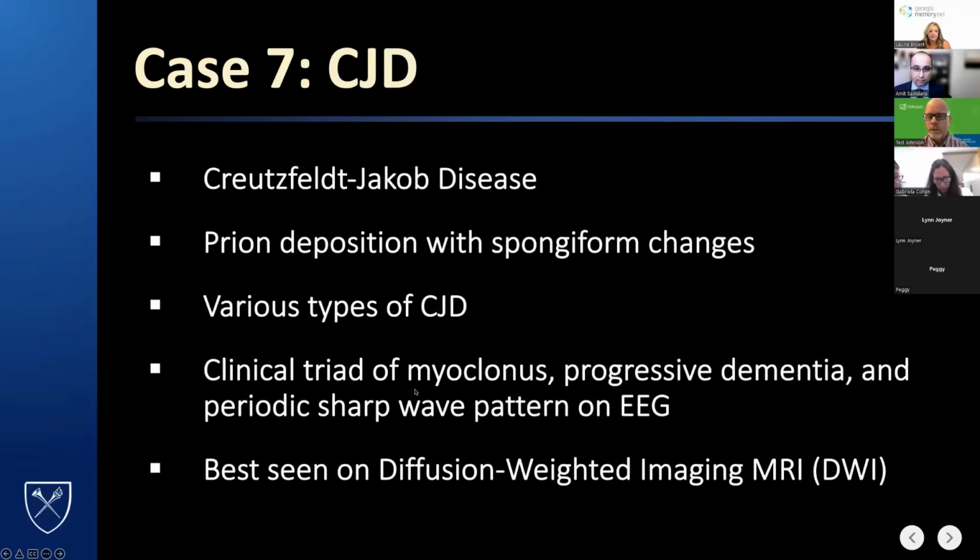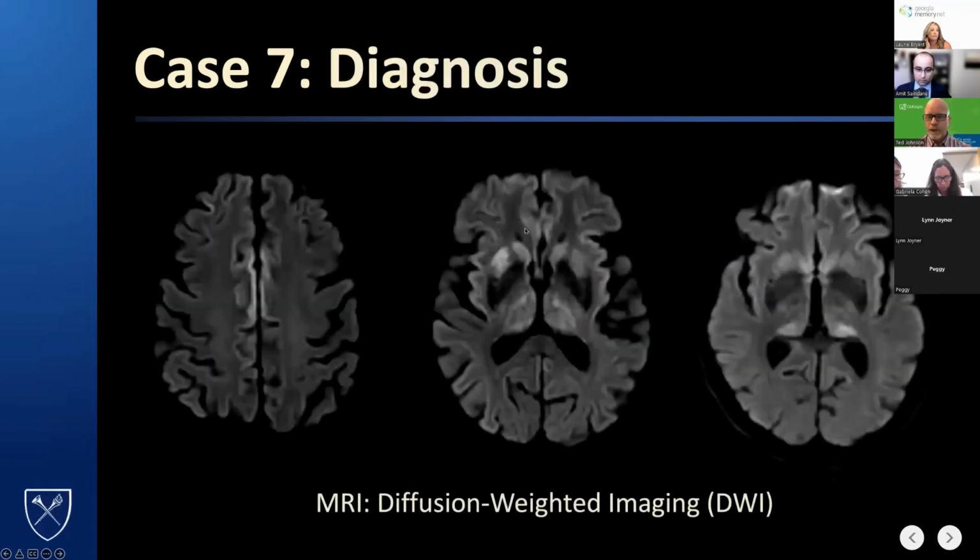This is a great image to think about when you as a radiologist look at the clinical history that's provided, because this clinical history shouldn't seem or feel like any of the other clinical histories that were provided. And so is it often that you get enough clinical history? Is it often that you're looking at that after you do your interpretation? Yeah, great question.